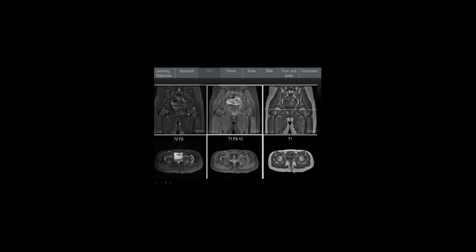All the way on the right, we have T1 weighted images. Recall that T1 weighted images are very good for showing us anatomy, and the fat is bright. And in the middle, we have contrast enhanced images. So this will show us areas of inflammation. Now, before I tell you what we see, I want you to try to decide yourself if you think that there's any abnormality on these images. Is there any asymmetry that you see? So I'll give you a second.